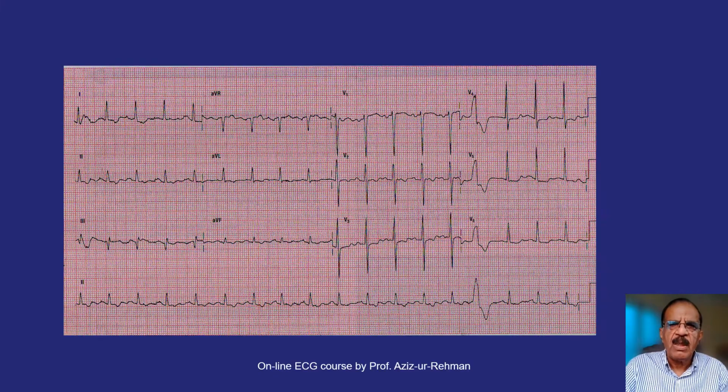Okay. So this is the ECG. I assume that you have watched the earlier parts, so I will not be discussing the basic things which I've covered in the earlier videos. So let's examine this ECG, and this is the rhythm strip. If you see, this is PQRS, PQRS, PQRS, PQRS, nice PQRS coming at regular intervals.